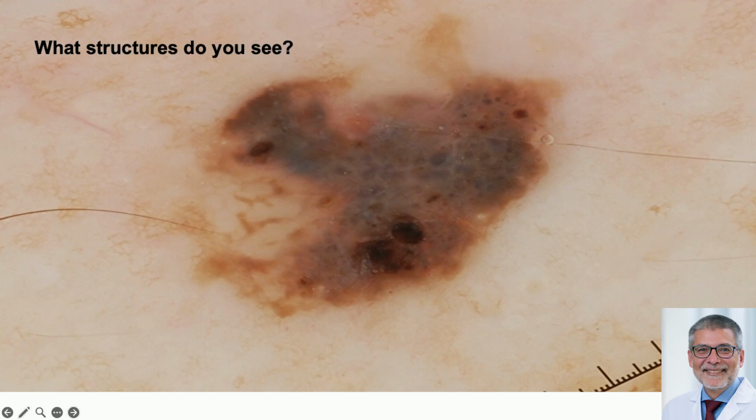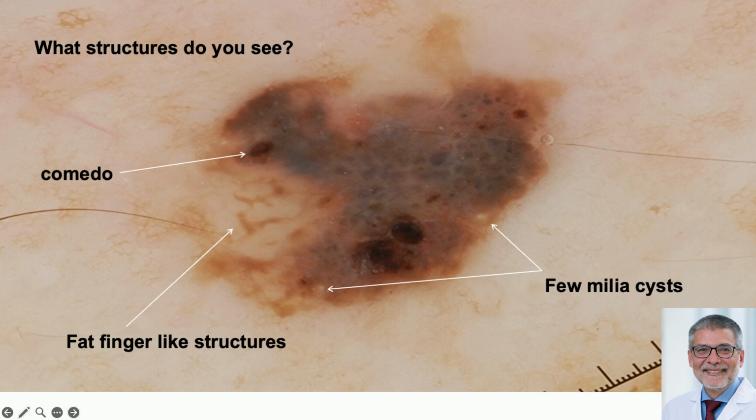That's kind of a normal thing. And so I give you an example of such a lesion. So here is a lesion that, yes, it was keratotic, but it had features that were a little bit confusing. It had some comedo-like openings. It had a couple of milia cysts. It had a couple of gyri. But then it had some irregular colors. It had some irregular globular structures. It looked a little bit chaotic.